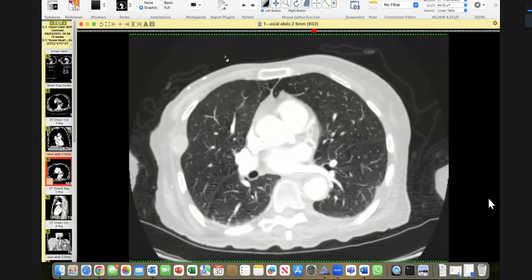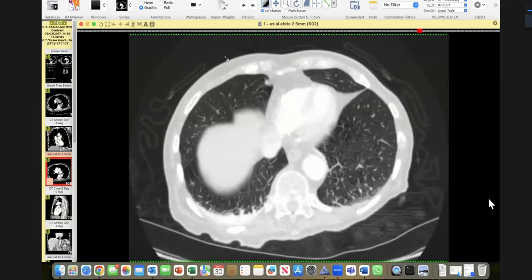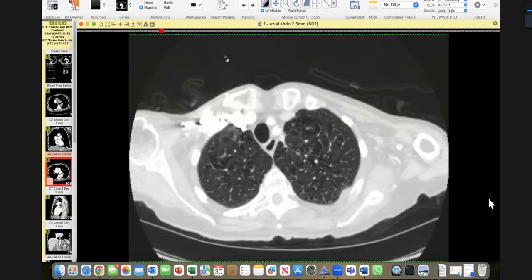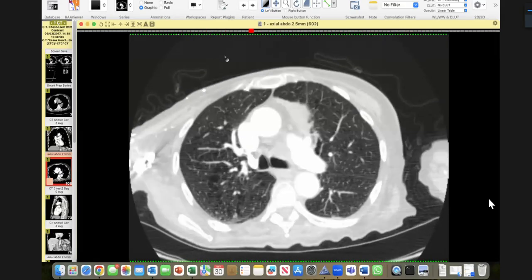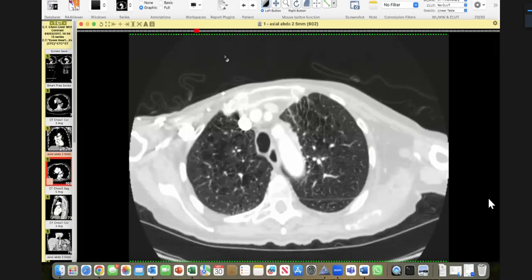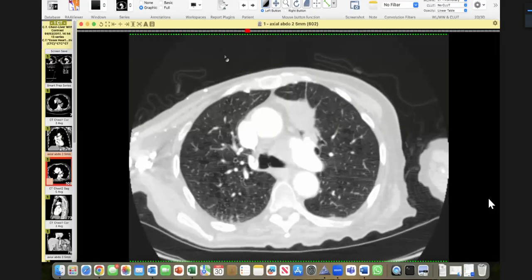Yeah, thank you. I'll scroll. So I'm provided with the lung window of a post-contrast CT chest. I'm taking my axial cuts. I'm taking my time to examine the lung window of the chest, specifically trying to examine the region of concern. Yeah, here it is. What I saw on the chest X-ray appears to be a consolidation at the anterior segment of the left upper lung lobe that shows a cavitation with spiculated margin.